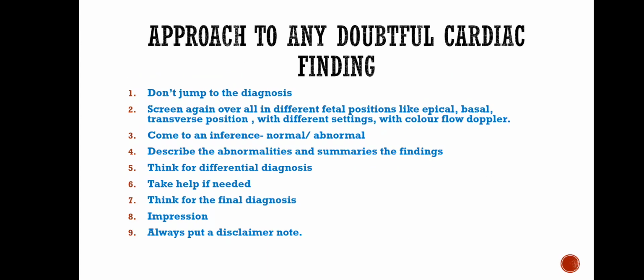Approach to our doubtful finding. When faced with a suspicious finding, do not jump to conclusions. Rescan the heart in different fetal positions. Use grayscale and color Doppler. Evaluate systematically. Describe what you see rather than what you think. Seek expert opinion whenever necessary. A disciplined approach prevents both overdiagnosis and misdiagnosis.